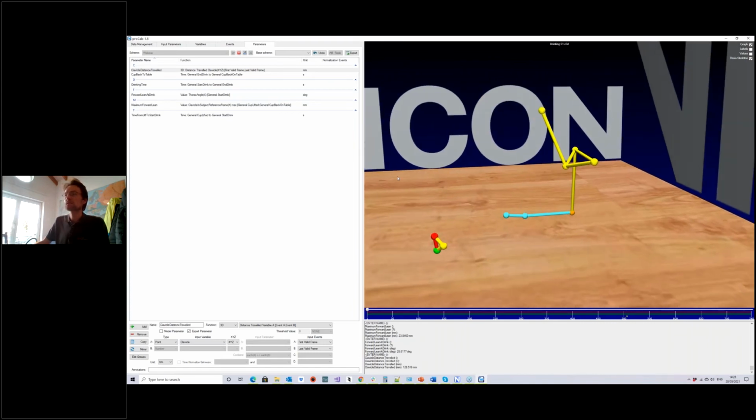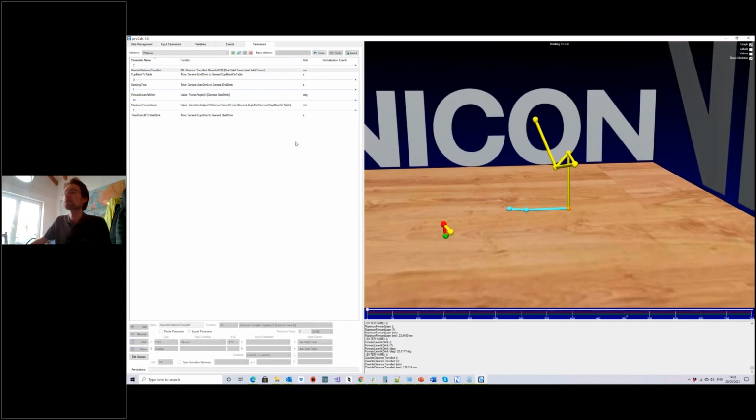Okay. This is essentially all I want to calculate for this research project. So I've now completed my work in ProCalc, really.